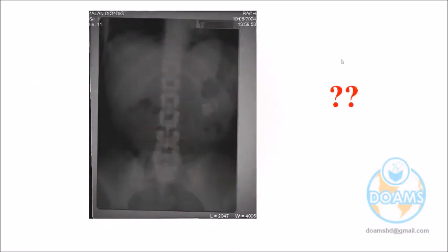What are you looking for, Dr. Abdullah, in the abdominal X-ray? We will see if there is air under the diaphragm. Oh, you are always looking for the air under the diaphragm. Any other thing? We will see if there are gases, gas distension, yes, like intestinal obstruction. Okay, anyway, you have seen the gases.